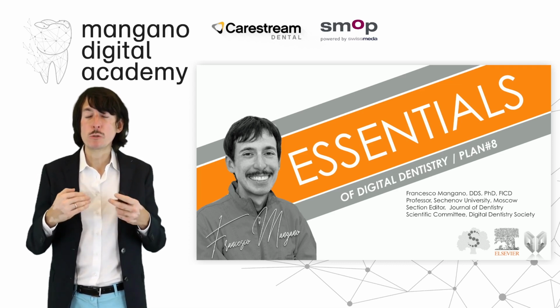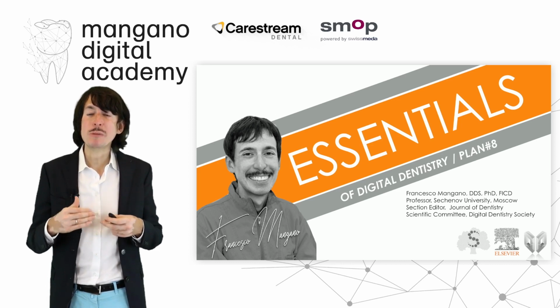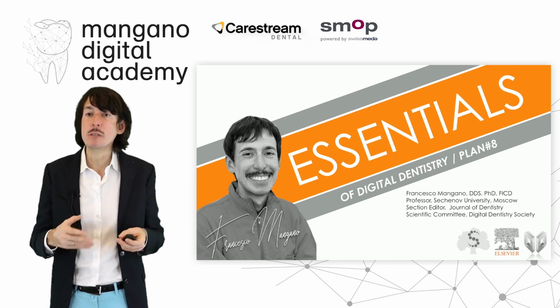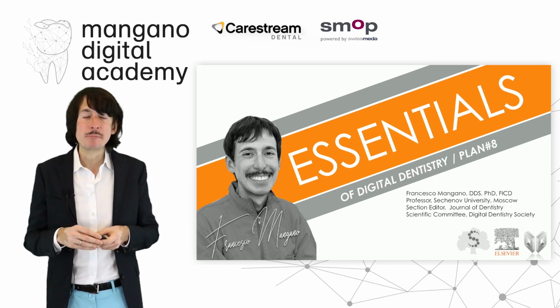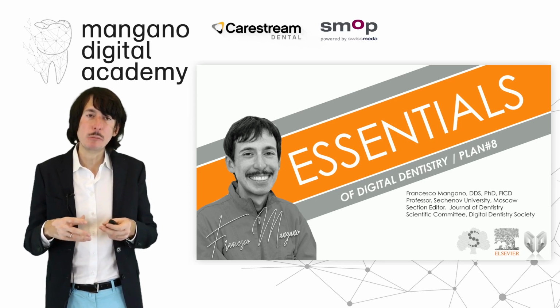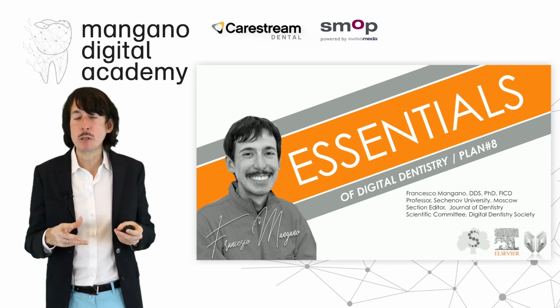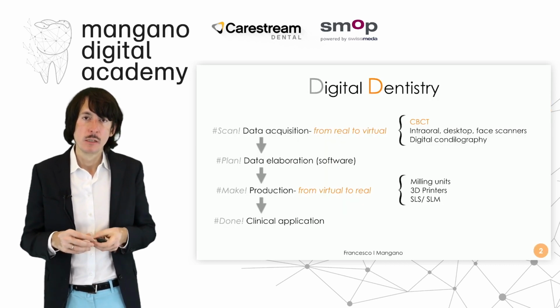So for the treatment of posterior implants, even single implants, in all cases we perform this kind of prosthetic reconstruction. I will talk a little bit about it, because it is very predictable, very nice, and helps the dental technician to design the final restoration at best. In terms of prosthetic emergence and tissue handling, I think it is the best option.